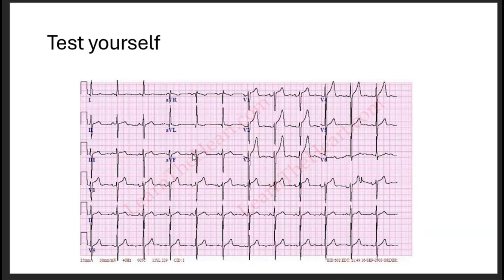So this ECG is actually a left anterior hemiblock. For left anterior hemiblock and left posterior hemiblock, the QRS doesn't have to be that prolonged. It can even be normal. But when you see left axis deviation and this weird pattern of QR and RS, then suspect a hemiblock. And if it's 0.12, also suspect, usually with very high suspicion, hemiblocks.